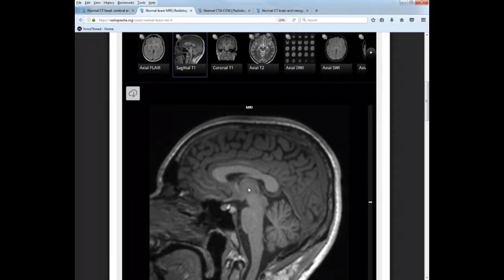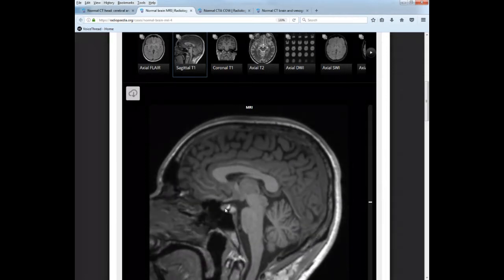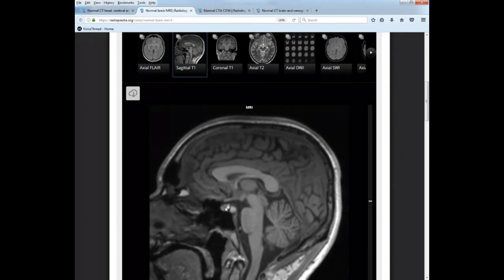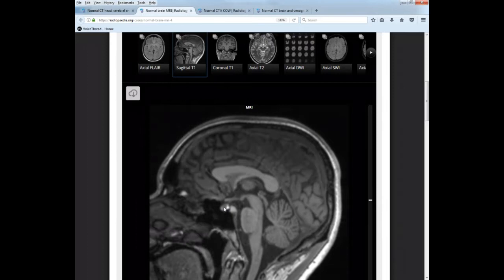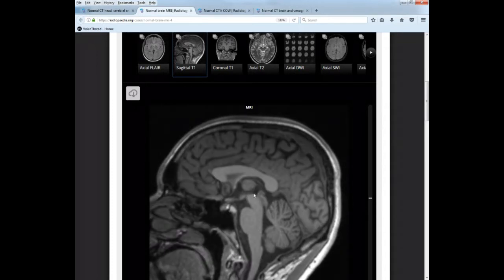Next we have the pituitary gland. All right, so pituitary gland is right here, okay, and it was a little bit calcified. So pituitary, then we have, remember that little stalk that goes up and will connect the hypothalamus, or the floor of the third ventricle, kind of right here, to the pituitary gland, and that's this stalk right here.